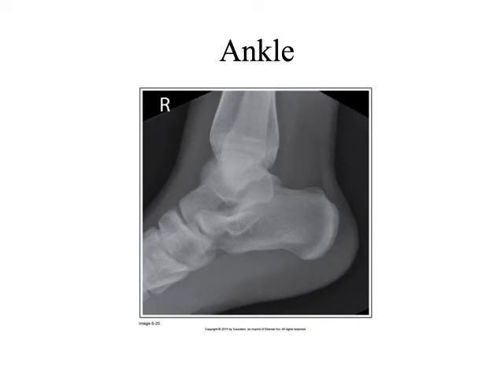If there is a fracture or some kind of trauma to the ankle, we might see dislocations of those bones, right? They may have somehow ruptured the joint capsule. And we want that tibio-talar joint space more or less at the center of the exposure field. Right about here. It's a little bit high, so they probably could have brought the exposure up some.